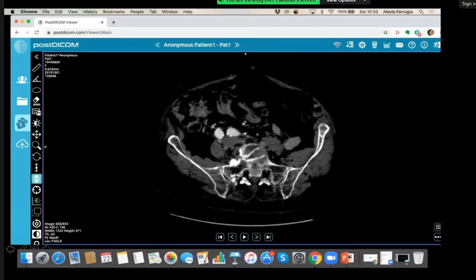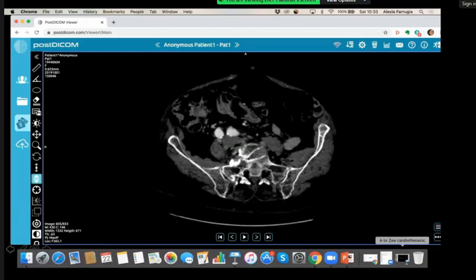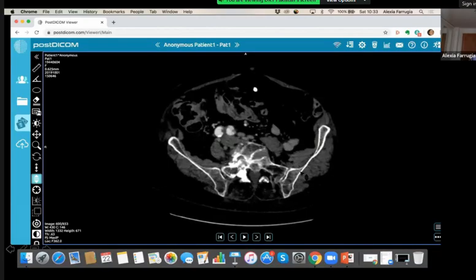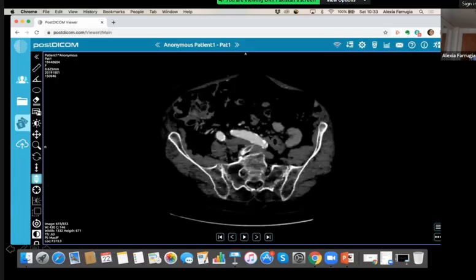I would call the vascular surgeons immediately to inform them of this finding. Let the surgical team know. Good. And the inferior extent of the flap is involving the left common iliac. So that's the end of the dissection flap, the inferior extent. So it's a very long flap, as you said.